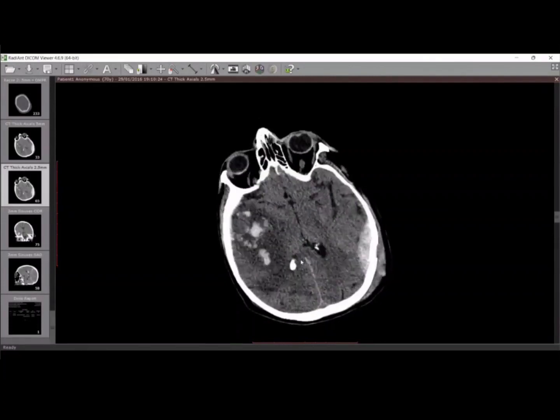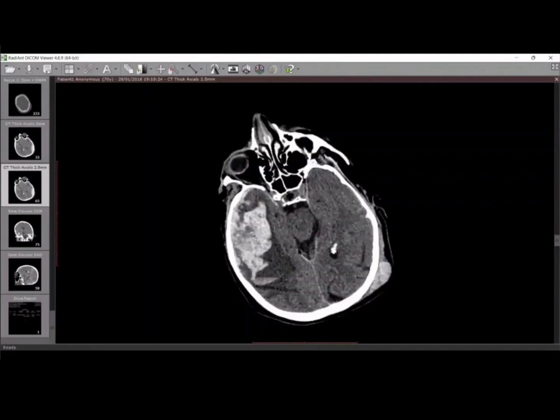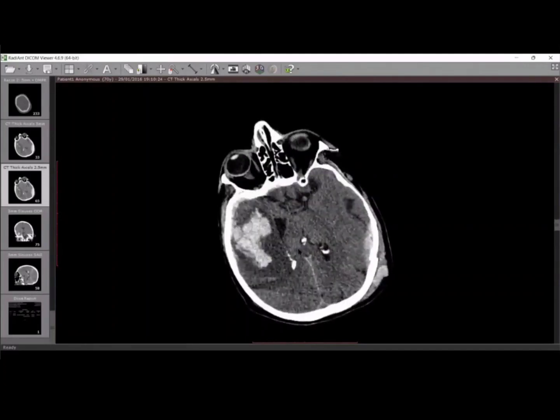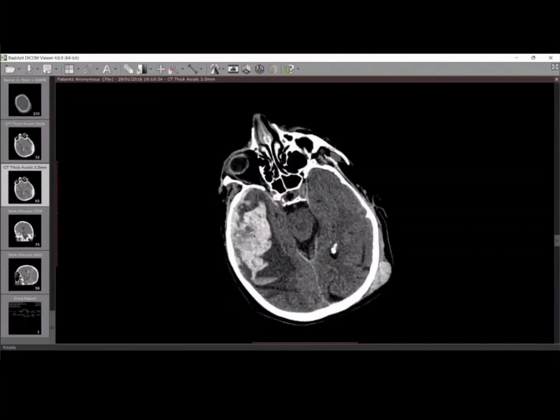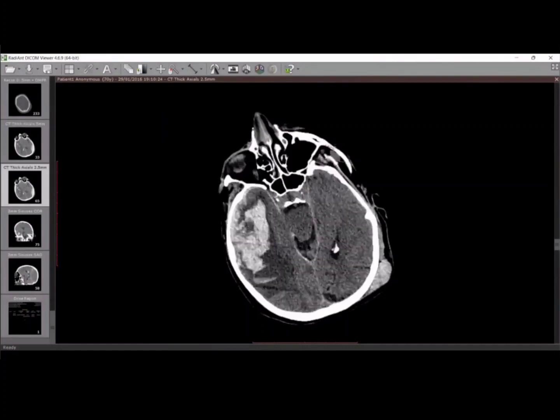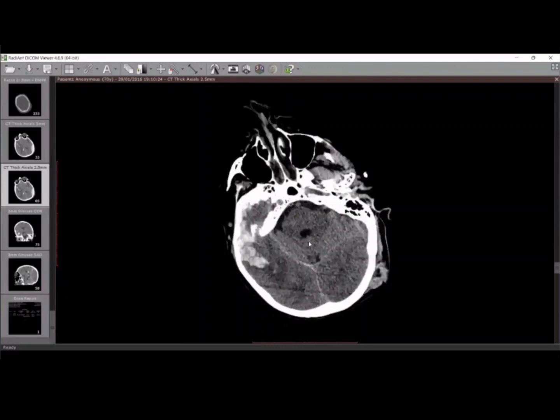I'm coming to the area of the midbrain. I'm trying to look at the herniations. I can see the quadrigeminal cistern is fine. However, there is mass effect on the right side of the midbrain, and also a contralateral push to the left side, but still the cisterns around it are intact.